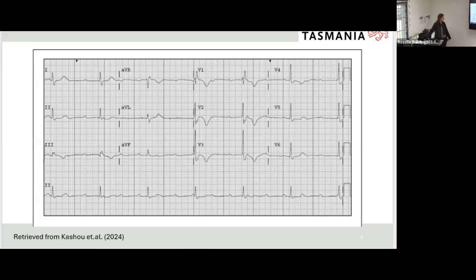All right, so we've determined our P waves are pretty similar. We've got our axis is normal. What about our PR intervals? Irregular. Yep, sometimes long, sometimes short. Is anyone confident that they're varied or dissociated? Yeah, I agree. Long PR intervals can indicate AV block.